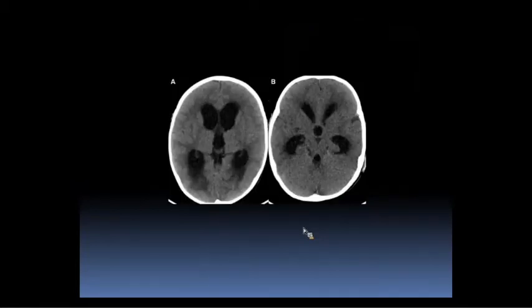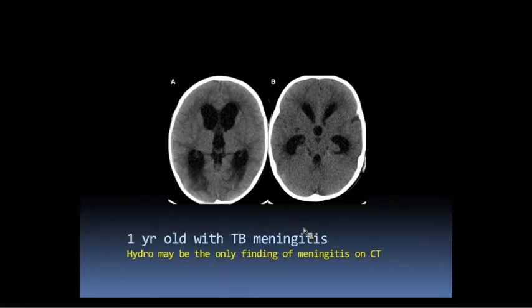This was also an infant with TB meningitis that had hydrocephalus, and so sometimes on non-contrast CT, that's the only finding we see. And even on contrast enhanced, they may or may not have abnormal enhancement, so hydrocephalus may be the only thing that we see on CT.